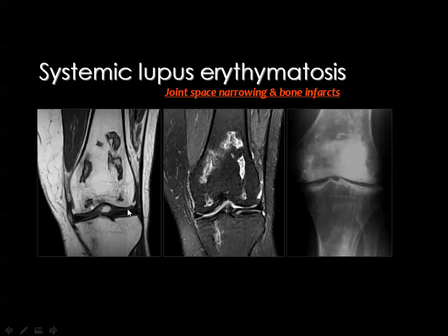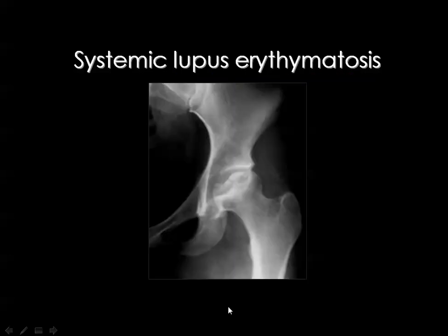They occur in the medullary cavity of long bones. They are similar to Chinese figures, with low signal in T1 and high signal in T2, may be surrounded by a dark rim from outside, but this appearance is very classic for avascular necrosis or bone infarctions.